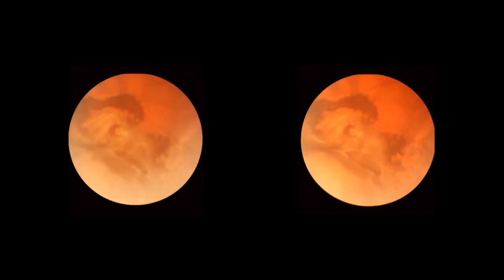This 50-year-old man was treated with cryotherapy for 2 tiny non-tractional round holes, which had produced a small subclinical retinal detachment at 7 o'clock in this eye. 2 years later, he was seen with this large horseshoe tractional tear just anterior to the treated area, and we must assume that it was a complication of that treatment.